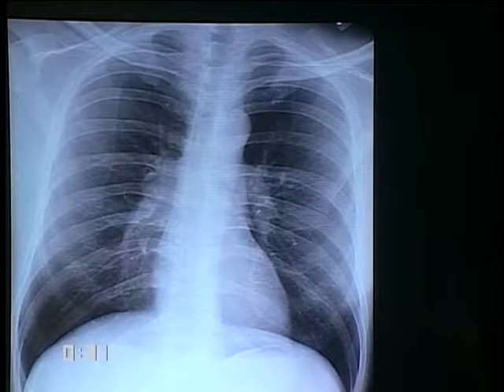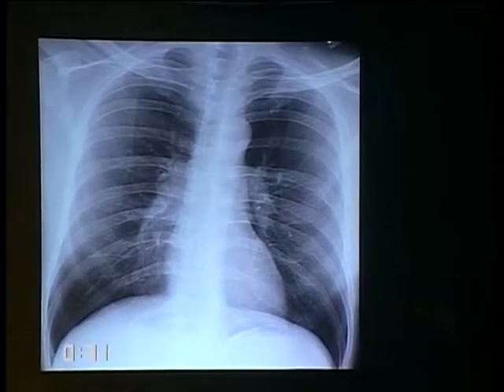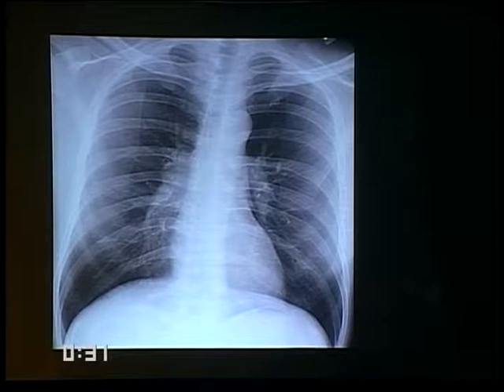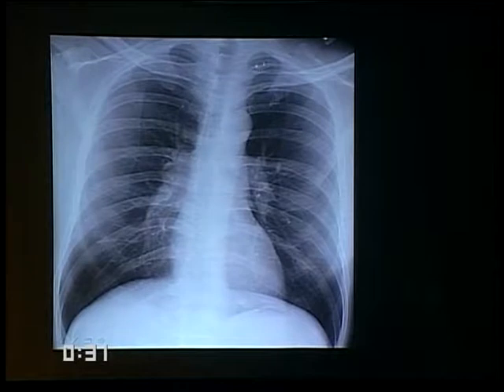The chest X-ray, of course, is very non-specific. It's not entirely useless, and before we get into the CT findings, let me show you a couple of examples where the chest X-ray did have some interesting findings. This is a patient who came in acutely hypoxemic and short of breath. And at first glance, I think the chest X-ray is perhaps unremarkable.